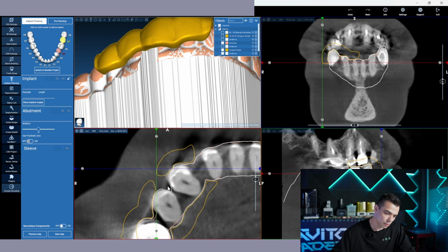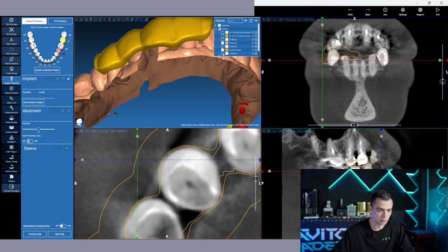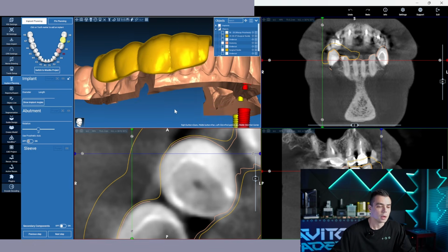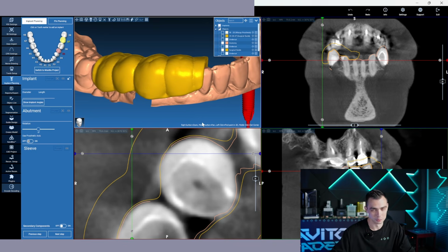will realize, now I will turn off the undercut, and here is the shape of the anatomy scan, and here is this hole. This is the axial view, and you see the shape of the tooth, and the shape of the guide intersects the border of the tooth, meaning that during the operation, your surgical guide will never ever fit the teeth, since they are not removed.